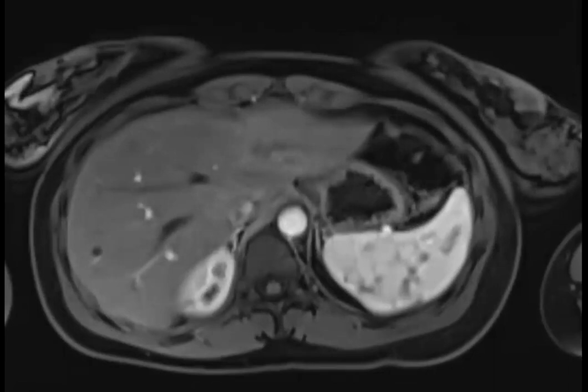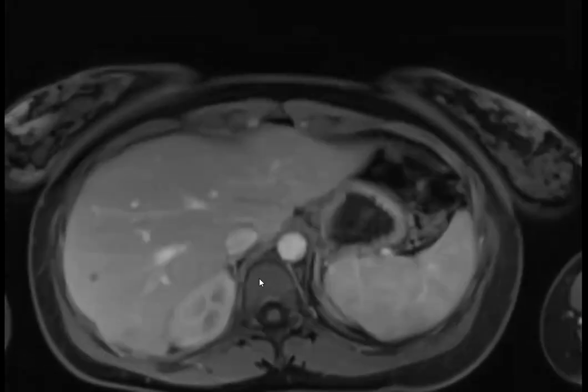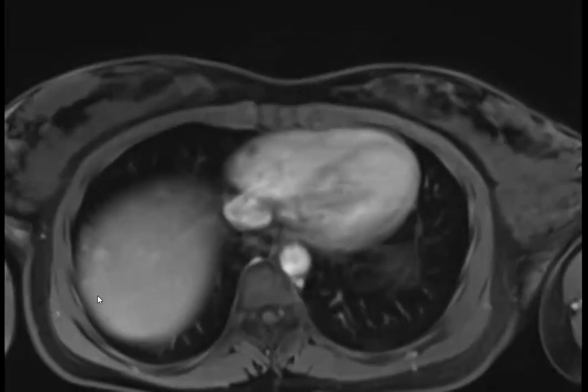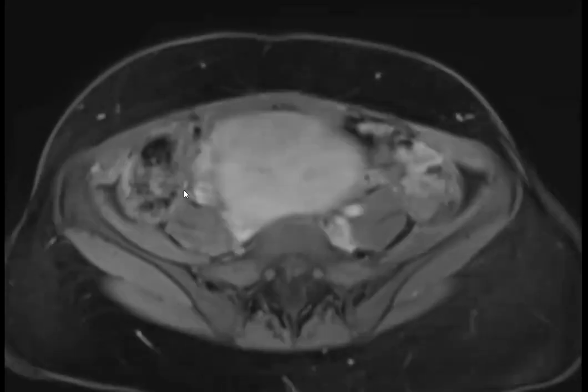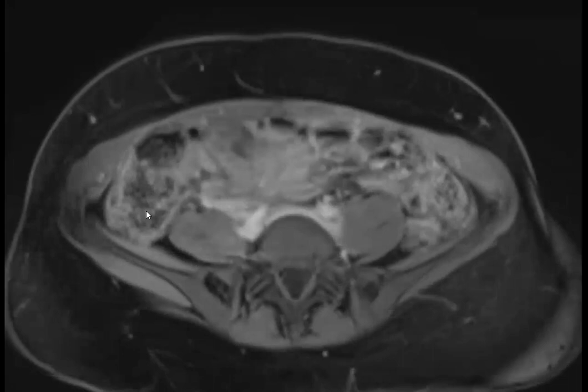Are they just more deposits of endometrium? Yes, exactly. So this is all endometriosis, and it actually makes sense. This is a really nice example of the multiple different patterns and distribution of endometriosis. We had those endometriomas in the ovaries. We also had spread to the right lower quadrant, which is a classic location, going onto the appendix or cecal area, and then also up into the liver.